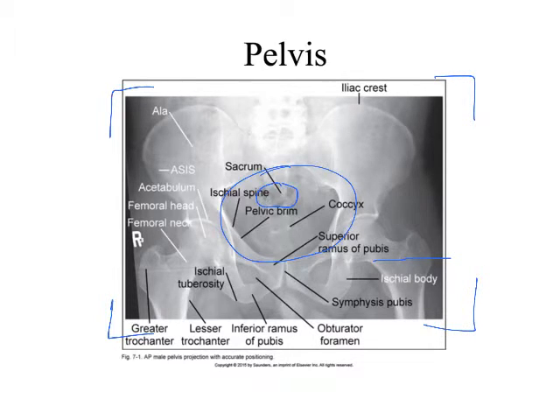Have you ever seen photographers doing this, walking around like that? Now I know that if I have things within that frame, like if I have 3 things within that frame, then I know that I'll also have the 4th, right? What I mean is if I have this iliac crest, this iliac crest, and this greater trochanter, I know that I also have this greater trochanter, right?